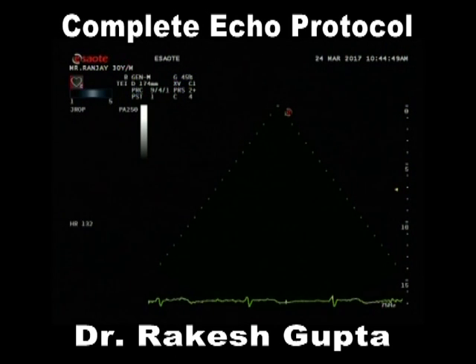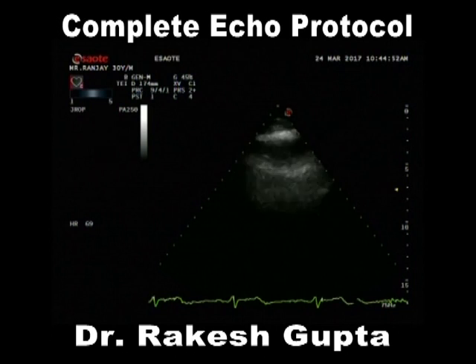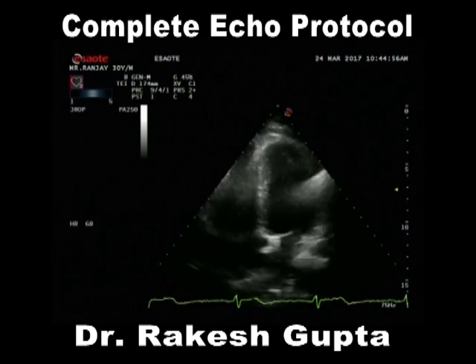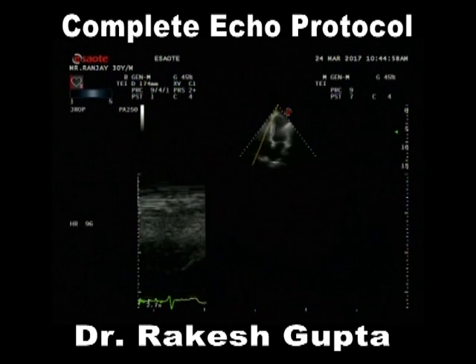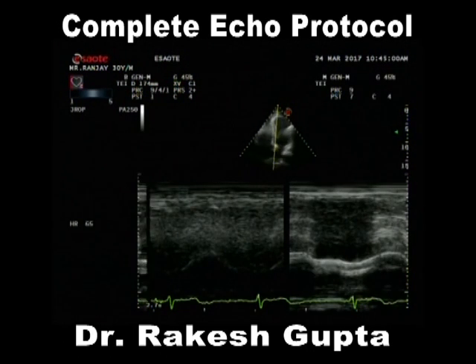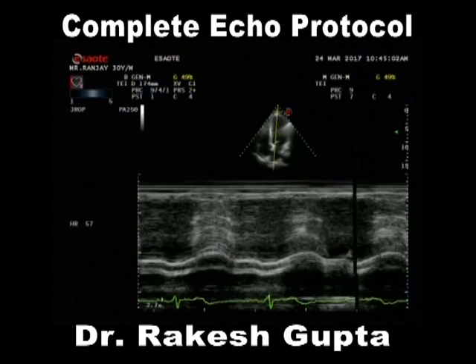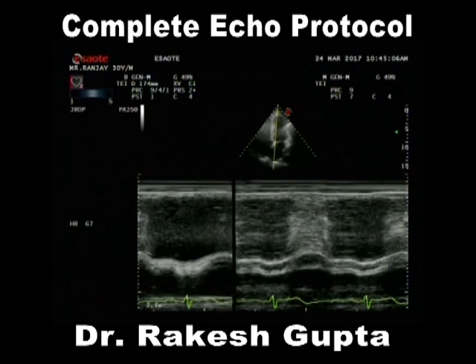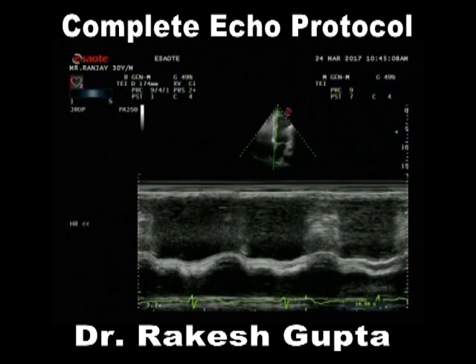At the same time, two important things we should add at this moment, by only M mode, by only 2 dimensional echo. One is MAPSE, which Prashar sir must have told you intermittently, mitral annular plane systolic excursion. As I said on the first day, the heart apex is fixed, but it is the base which moves towards the apex.